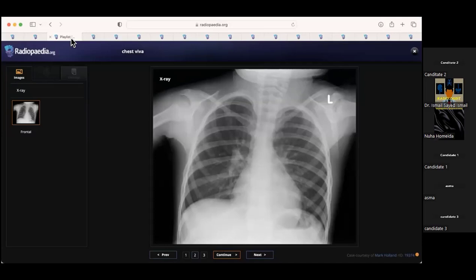This is a frontal chest radiograph of a skeletally immature individual who presented with shortness of breath. I'm checking both lung fields for any opacities, and I will go systematically and review the review areas. The supraclavicular regions, hilar regions, left retrocardiac region and subdiaphragmatic regions are clear.